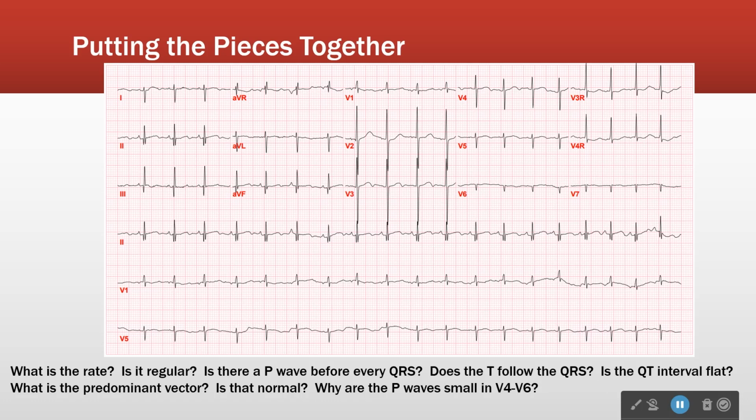Yes, 1-week-olds have hearts that work just like ours do. One of the things you see in pediatric EKGs, look at the height of that thing, that big, tall QRS complex. A lot of times, children's EKGs get labeled as left ventricular hypertrophy, like they've been having high blood pressure for 20 years, when they've only been around for a week. What this really is, is the fact that babies are so small that the leads are very, very close to the heart. So we get big leads in V2 and V3 in particular, because the heart is literally right there.